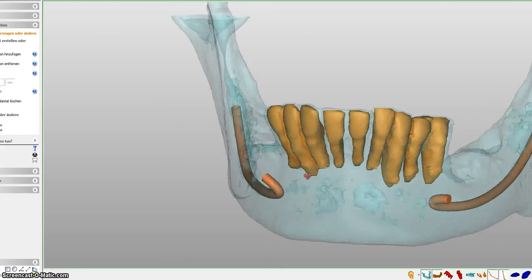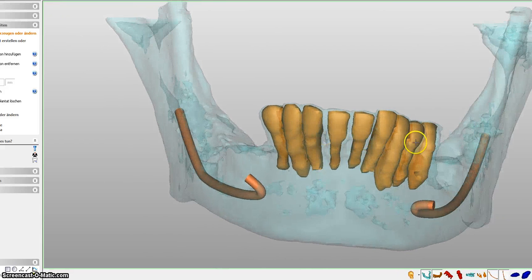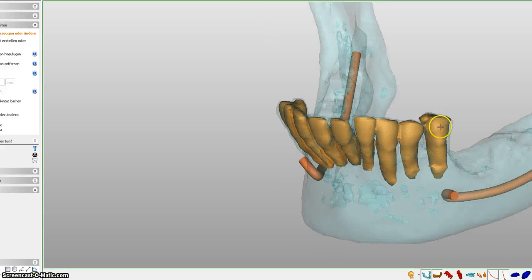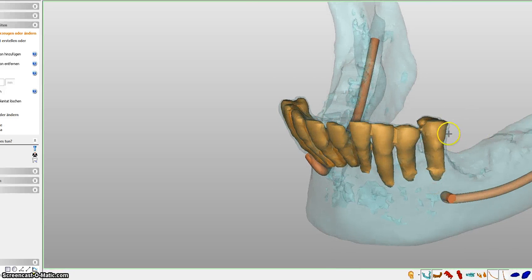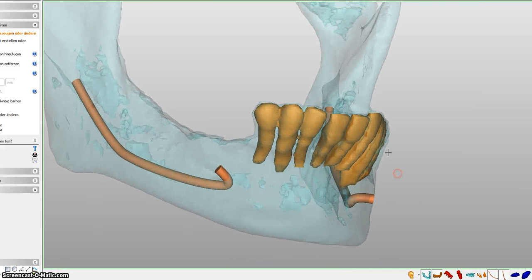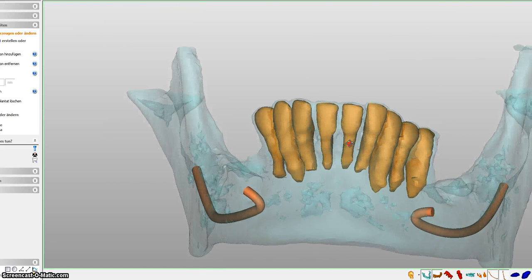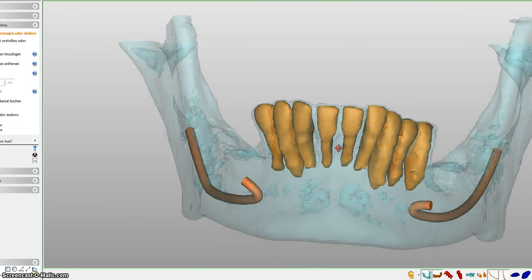If we look at this situation now, you have some teeth here in the front, and also on the left side you can go all the way to the back. This is tooth number 5, you have teeth until tooth number 5, and usually we reconstruct teeth all the way up to tooth number 6. On the other side you have tooth number 4 here, 5 comes here and 6 also here. So there you have one treatment plan which Kata will explain to you.